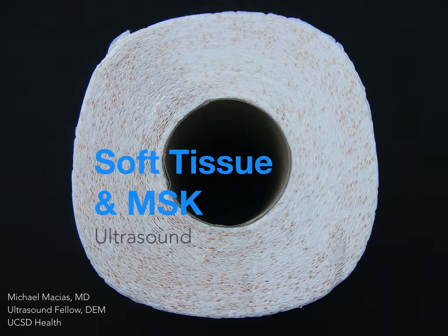Today we're going to give you a brief introduction to soft tissue and musculoskeletal ultrasound. The reason we talk about this is because MSK and soft tissue complaints actually rank among the top 5 most presenting conditions in the emergency department.